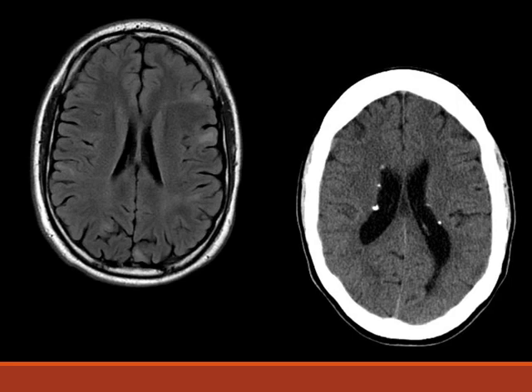You can see them there, these high signal lesions. 95 to 100% of patients with tuberous sclerosis will have tubers, usually in the frontal lobes. They are hamartomas, so they'll be low signal on T1 and high signal on T2. They do not enhance nor do they calcify. So the subcortical or the cortical tubers will most likely not enhance and not calcify.